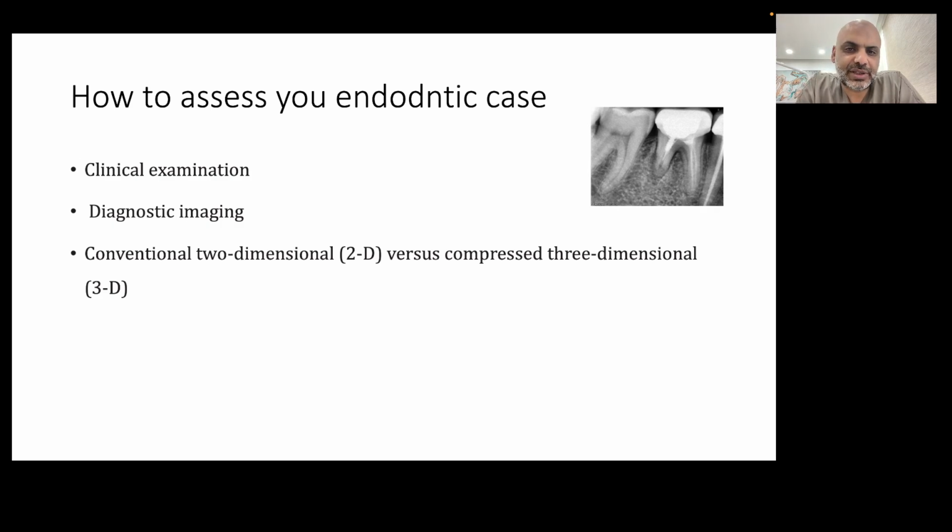لما تجيني endodontic case, how I will assess the endodontic case. We should start with clinical examination. احنا أي كيس هتجينا هنعمل clinical examination, then we go for the diagnostic imaging. Diagnostic imaging, usually we use the two-dimensional X-ray, the conventional X-ray, like the one on the top right side.